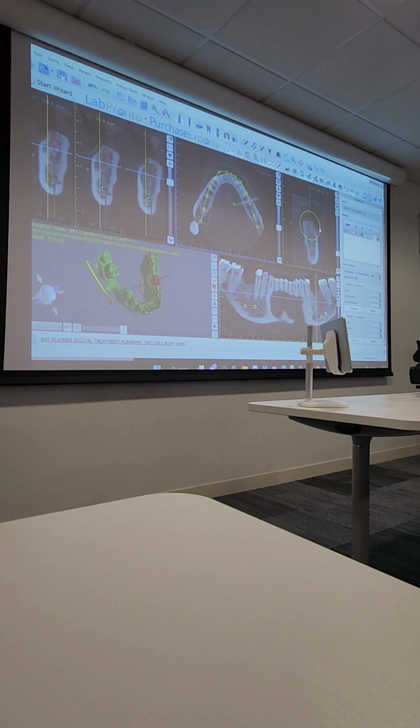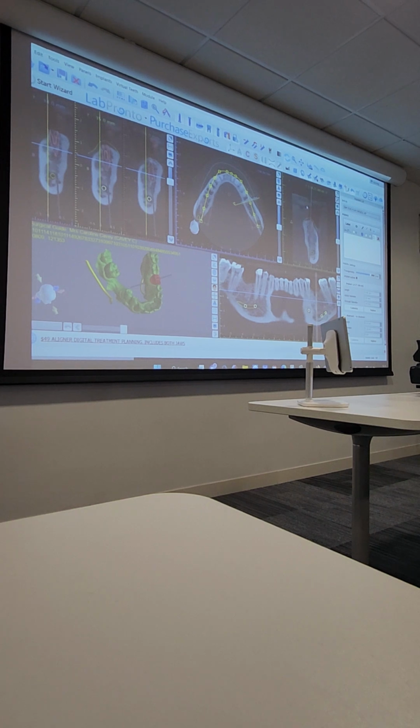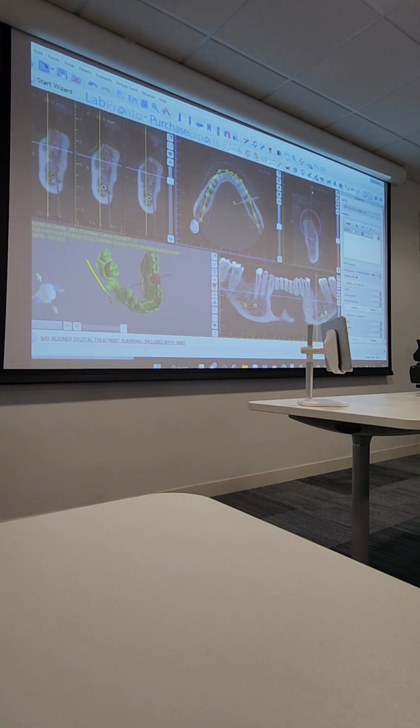I'm going to change the angulation. I'm just showing you the features. I'm not planning anything really, but I want you to understand. So change your angulation, and I'm doing that in relation to the red. What's the red? It's my tooth. I've got my tooth in my head, not the implant. So my implant might end up looking like this because I wanted the trajectory of the implant to go through my tooth. Once I'm happy here, let's take a walk around it.